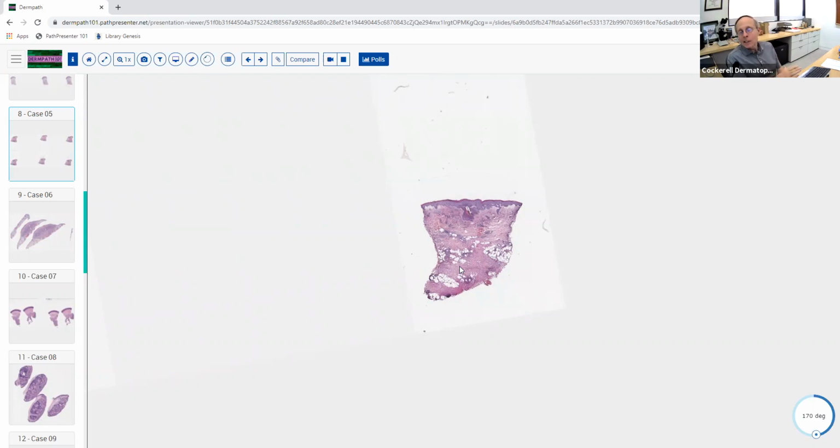You can see it on H&E. So anytime you can see something on H&E, you don't really need a special stain, the vast majority of the time. So that's just another pearl. If somebody says, well, did you do a mucin stain on that? You should say, you don't need a mucin stain. That's a crutch. So you don't need it. All right, thank you.